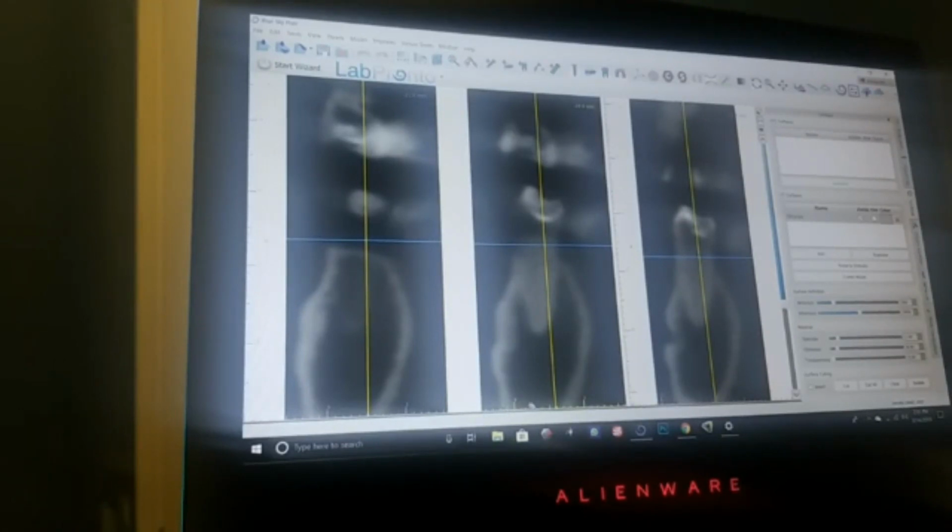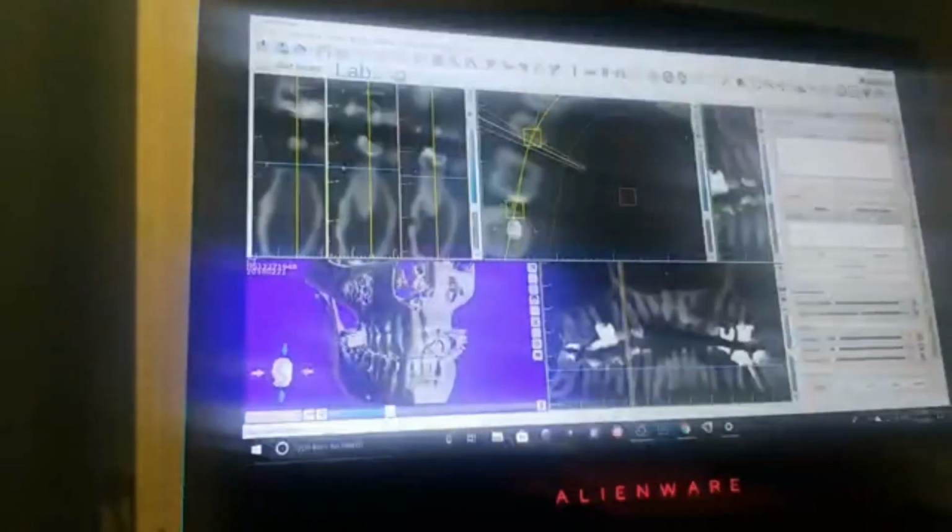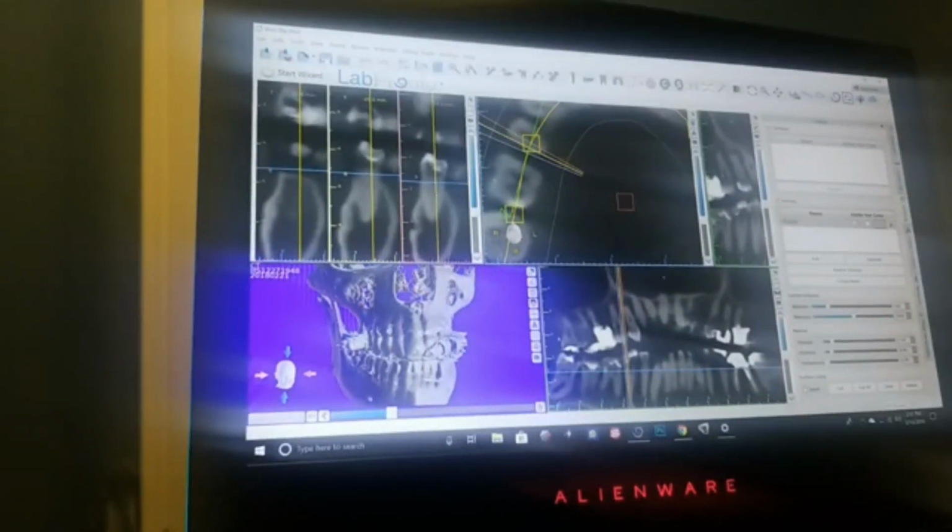It gives you the number of millimeters that you should look at. So this is yellow. This side, it's a little bit harder to see, it's purple. And this side, it might be easier to see, it's red. When I minimize this and I'm looking at this, we got yellow in the middle, red to the right, and purple to the left.